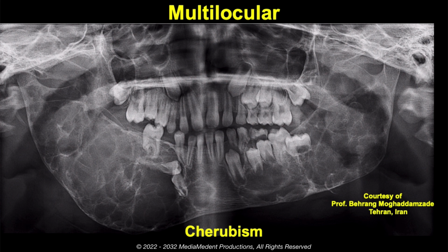The radiographic appearance of cherubism may be similar to that of the giant cell granuloma. However, cherubism's bilateral presentation should provide a clear differentiation. Because of its rather unique presentation, the diagnosis of this condition may be based on the age of the patient, familial, and radiographic evidence.